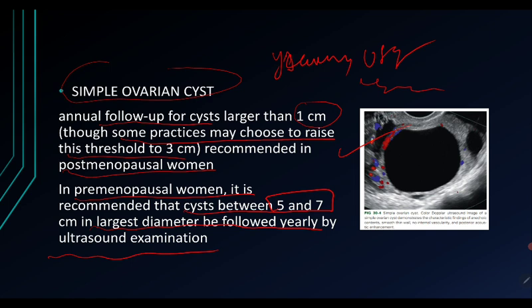Only a simple appearance needs nothing to be done, unless it is more than 8 centimeters, then you consider some operation or something after doing tumor markers. If there is some suspicious malignancy, you should go for surgery. Simple appearance is seen on color Doppler image.